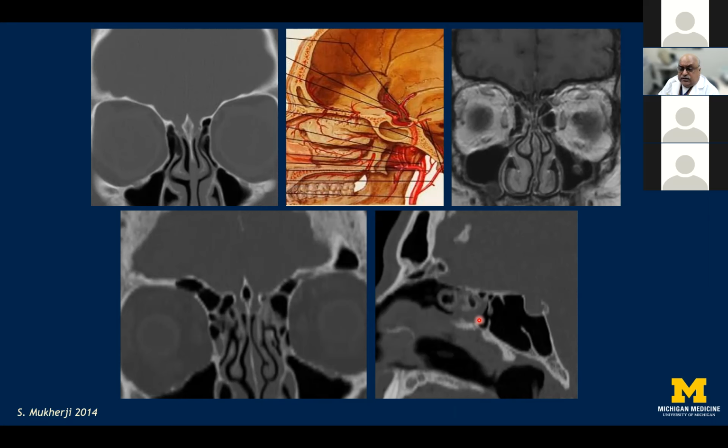So different types of classifications and different types of measurements have been made just to assess the depth of the olfactory groove, because as you can see, it's intimately connected to the insertion of the middle turbinate. In any functional endoscopic surgical procedure, if one is not careful, you can pull at these structures and then cause damage to the cribriform plate, and hence lead to defects in the anterior skull base, which are commonplace causes for CSF rhinorrhea or torrential hemorrhage in those instances where the anatomy is neglected and not looked into.